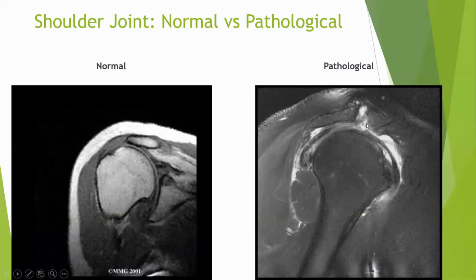There is obviously, as you can see, tendon perforation, because white fluid is in between the tendon, and that's the reason there is increased signal intensity of the tendon area right over here. The intensity should be less, or darker in color, but this is very white in color. That's the reason you have lots of fluid in there. So that's basically it. You just have a rotator cuff tendon tear, nothing else in there.